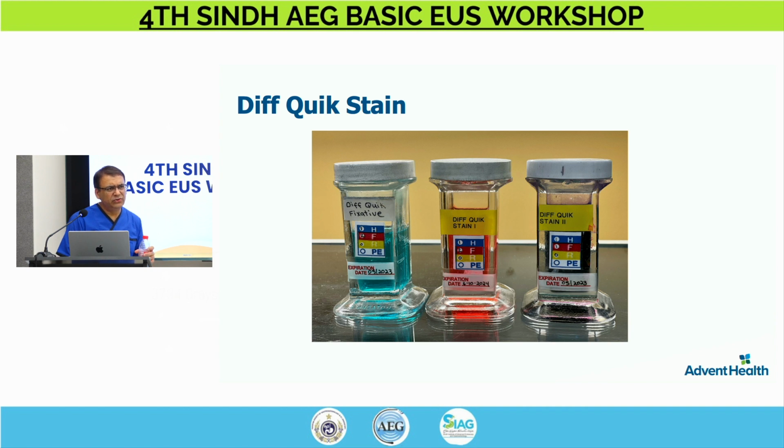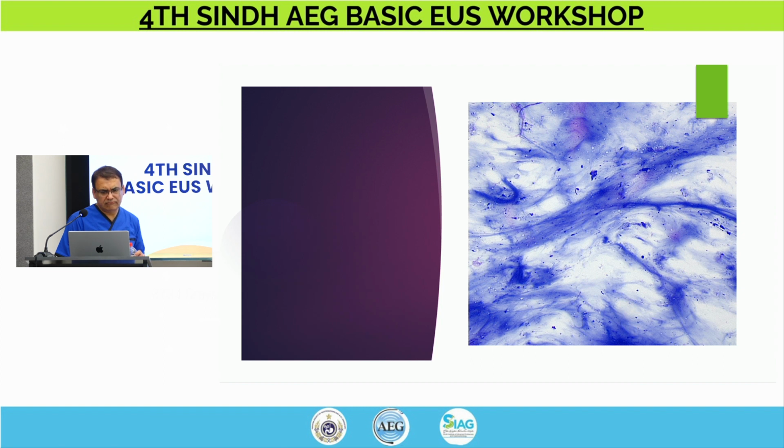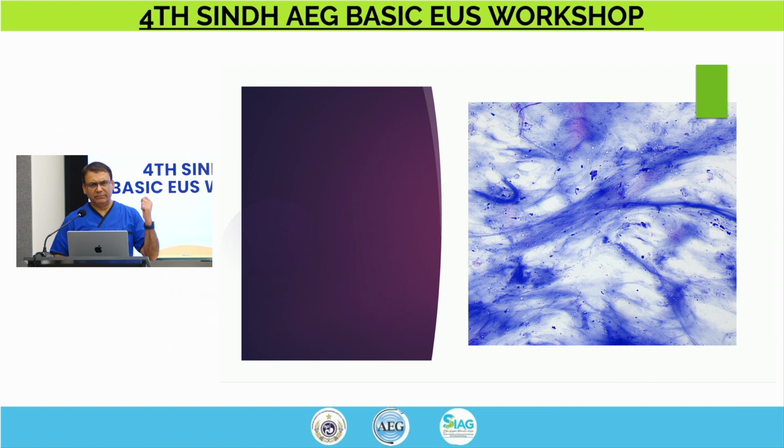Okay. These are the stains we use here, right? Yes. There's a fixator, then there's a blue, that is a nuclear stain, and the cytoplasmic stain, pink. Okay. And remember to change them after every 30 days. We have those small bottles, and every single specimen has a different set because there is a risk of cross contamination when you're making slides.